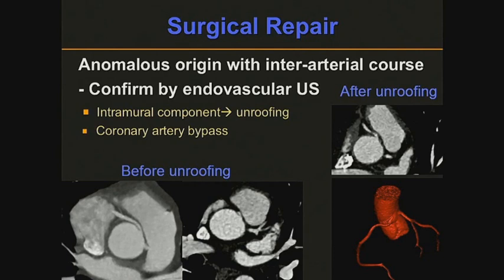This is MIP'd up, so if I want to really see how it is, I have to take the MIP, the maximum intensity projection, down to normal thickness. And when you look at it, that ostium is narrowed, and it does seem like it's traveling in the wall. So if they resect that little bit here, that looks like a flap, then suddenly the ostium will be displaced more laterally, and instead of coming off like this narrow turn, it'll come off a little bit more vertically.